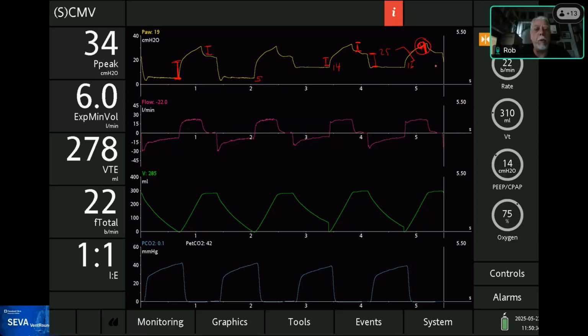There is another minor point that I don't want to confuse with what you just said, because that was an excellent explanation. In the chat, I noticed Karsten said that some of that initial rise in pressure could be due to overcoming the auto PEEP. So if there was no airway opening pressure problem here, and there was auto PEEP, then the airway pressure has to rise to the level of auto PEEP before you get any positive flow. So there is a little rise in pressure that's equal to the auto PEEP initially, just to get flow to go to zero.